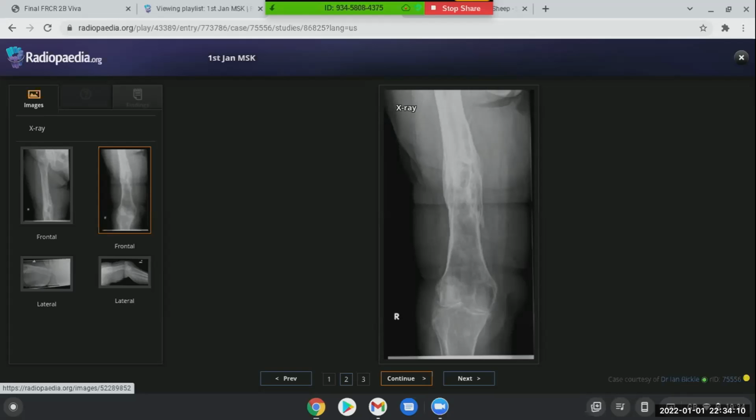Okay. So in the chronic osteomyelitis, can you see any sequestrum in this? In this case, there's some ill-defined sclerotic areas inside this lucency, but maybe not clear on the shared screen. But this one could be representing a sequestrum actually, this ill-defined sclerosis within the central lucency. So I would go more with this sequestrum inside the lesion. So this supports the diagnosis of the chronic osteomyelitis. Okay.